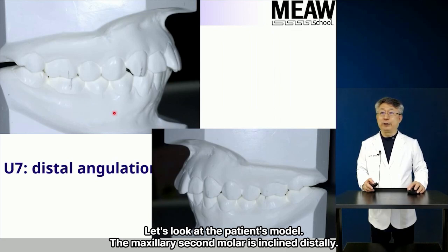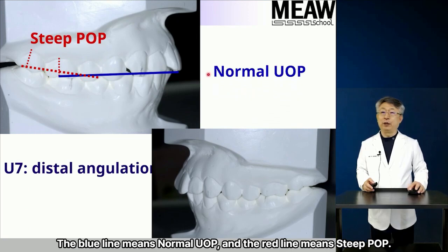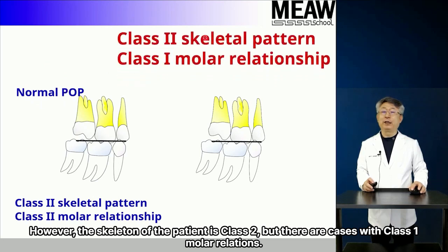Let's look at the patient's model. The maxillary second molar is inclined distally. The blue line means normal UOP, and the red line means steep POP. If the patient's skeleton is class 2 and has a class 2 molar relationship, it usually shows normal POP. However, the skeleton of the patient is class 2, but there are cases with class 1 molar relations.